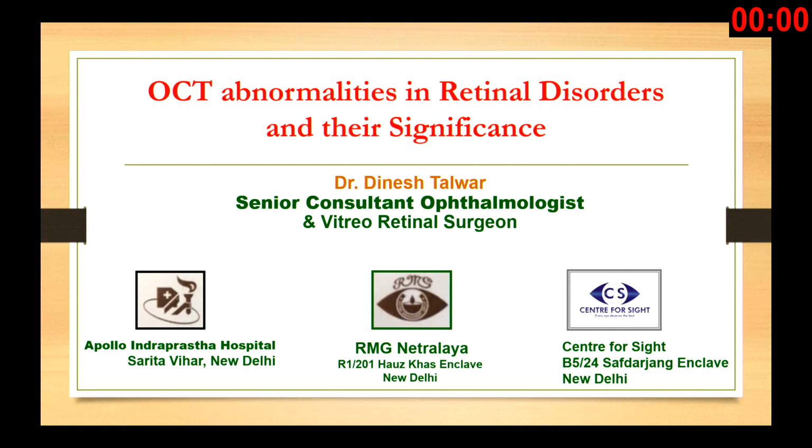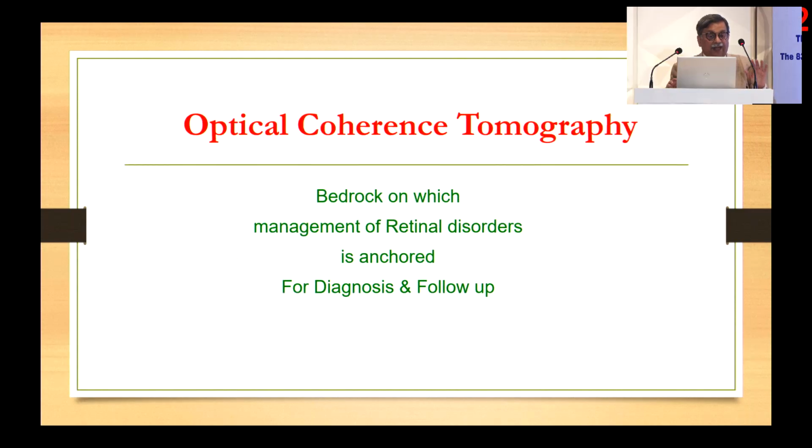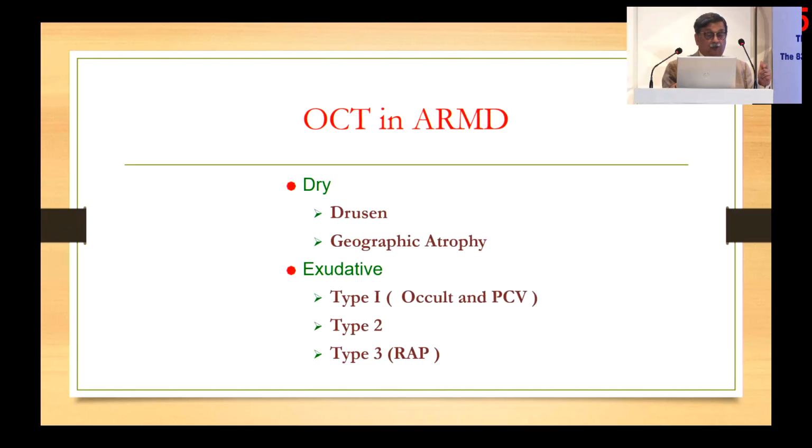Thank you. Ladies and gentlemen, you've already been exposed to the kinds of abnormalities you see in the retina on an OCT. Now, let's discuss their significance. This is my disclaimer. The fact is that OCT is the bedrock on which the management of retinal disorders is anchored, both in terms of their diagnosis and their follow-up. The abnormalities that we will see can be used for diagnosis, for treatment, for follow-up, and for prognostication.